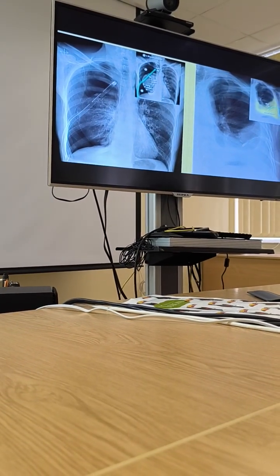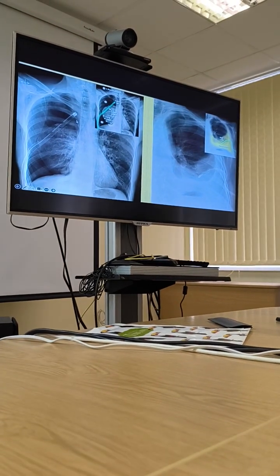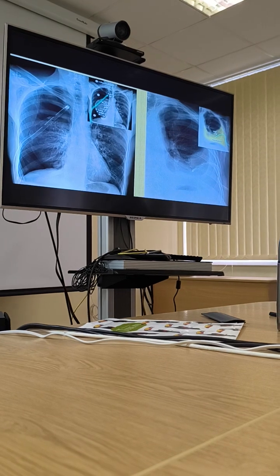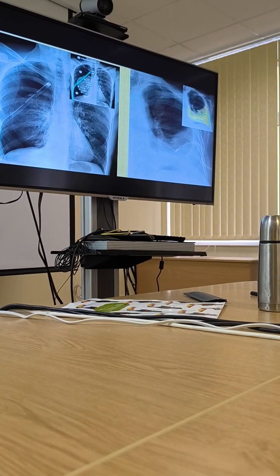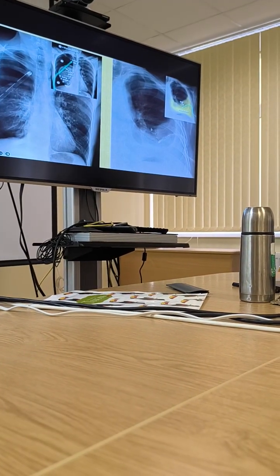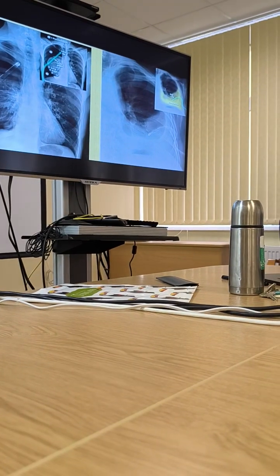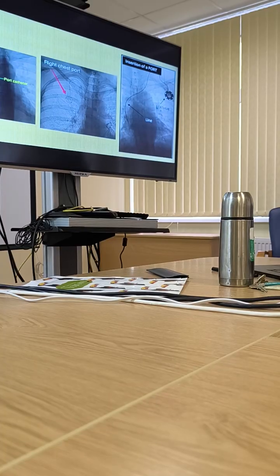So if you see this drainage tube with the tip in an upward direction, what do you think is the problem? What are we draining? Air. And if it is in this position with the tip down, that usually means that this is fluid drainage. So keep this in mind. This is a simple rule that can be really helpful.